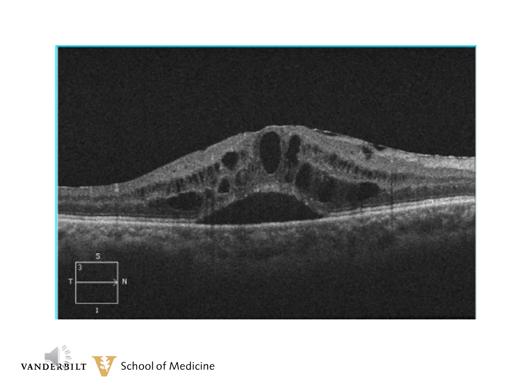Here is the patient's OCT. The main things to notice are the intraretinal cystic areas in the foveal area. Now, he also has some subretinal fluid, which can be seen in severe macular edema, whether caused by the Irvine-Gass syndrome or also with diabetic edema and vein occlusions. If you look closely, there's also a very small epiretinal membrane, but that is incidental and it is not contributing to this patient's edema.